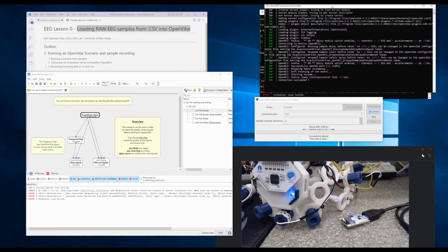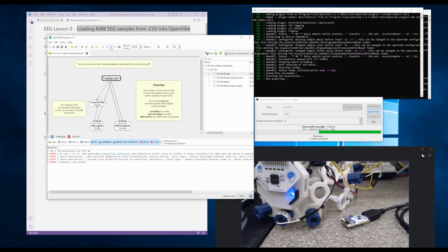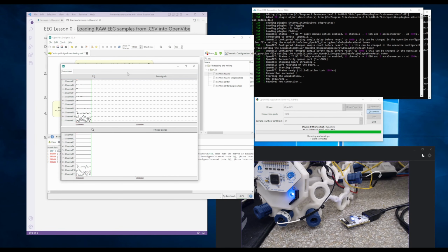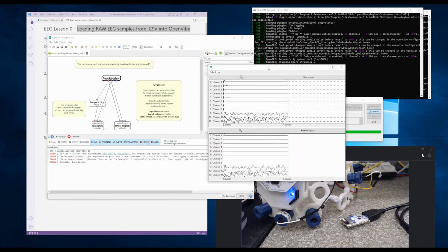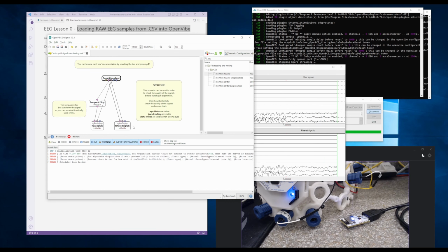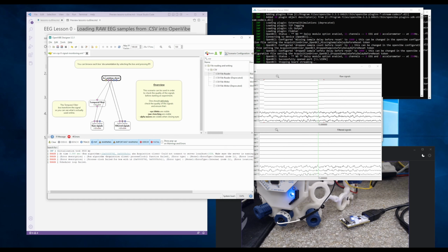So put that here. Oh, and play. Now it's sending. And now if I press play, there we go. So here you see two signal display windows, the ones depicted here. Filtered signal shouldn't be called filtered signals, should be called raw signals. Oh, I didn't notice that.